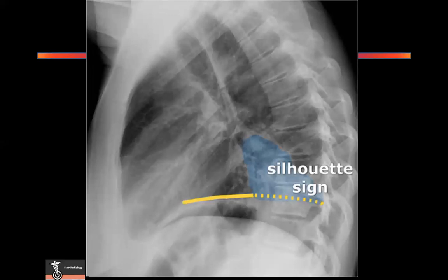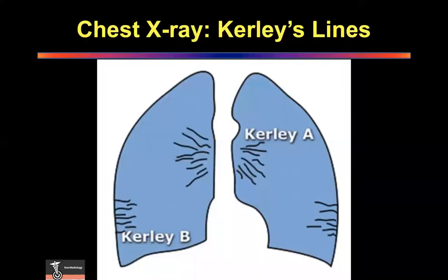So next time you see a chest X-ray, don't just have a look and jump to the CT scans. Particularly exam-going people, please, on every ward round, look at every chest X-ray and try to identify all these structures which I asked you to identify. And slowly you will become so good at it that the CT will be a piece of cake for you. The moment you've seen something on a chest X-ray and you correlate it with the CT, you're on a winner, okay?